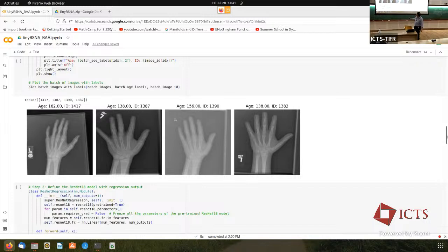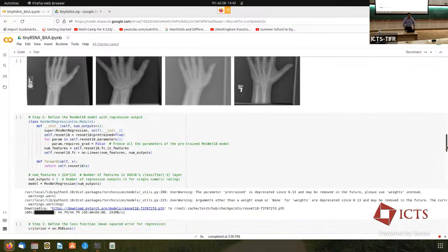You can see that the aspect ratio is distorted. You can almost guess it. I don't know if you can see it in this image, but I've stared at these things long enough to know this is bad aspect ratio, and this one also. So the aspect ratio is something that you can worry about as a second step.